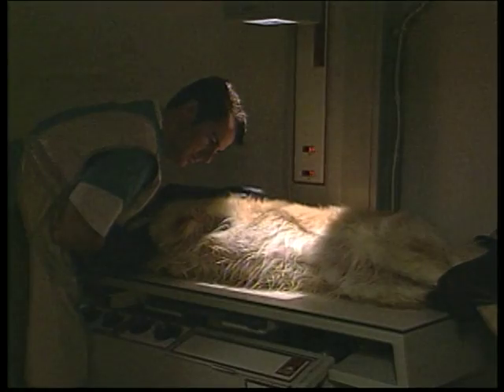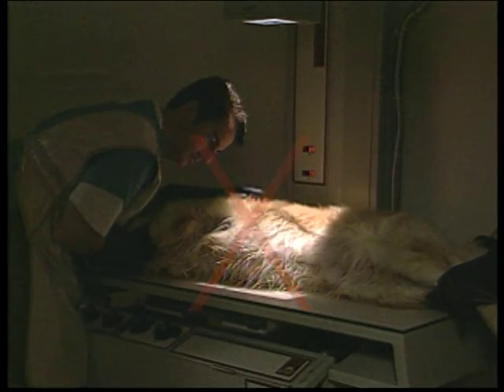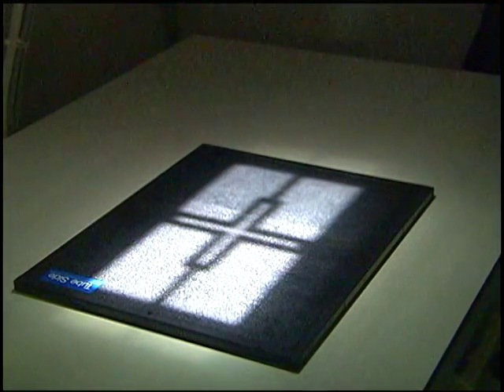in the neck. The best way to limit the body's exposure to X-rays is to keep arms, hands, and head out of the immediate X-ray beam when the exposure is occurring. The farther you stay from the primary beam, the safer. The location of this primary beam is made obvious by a white light.